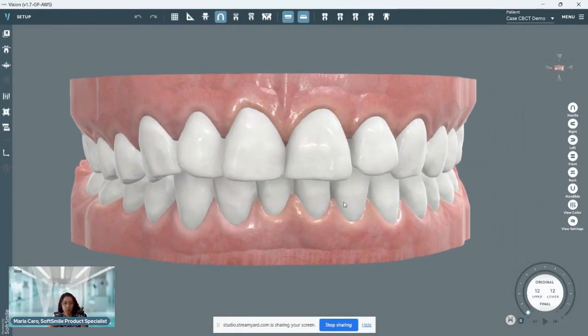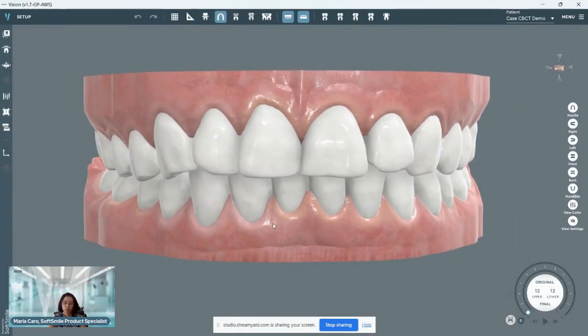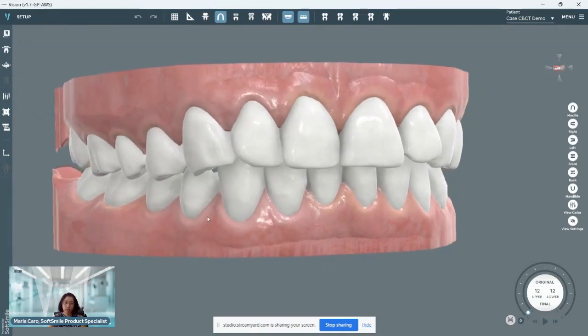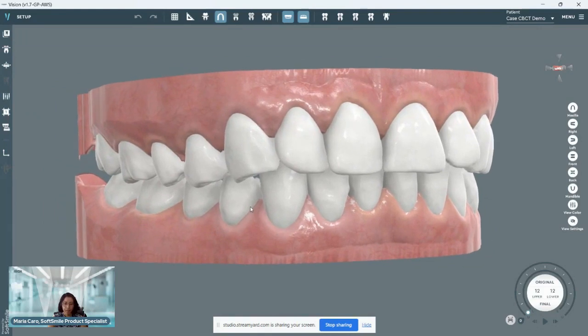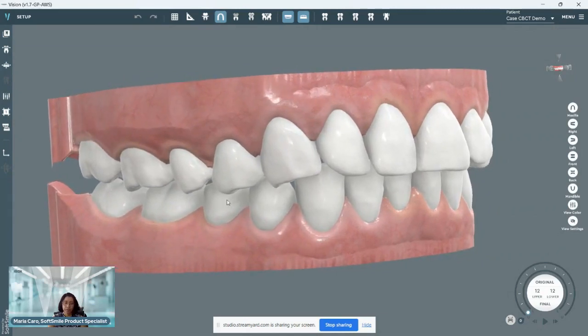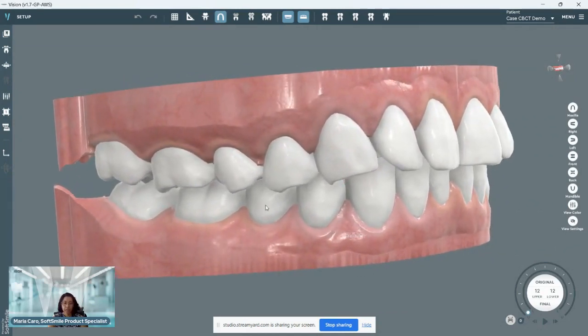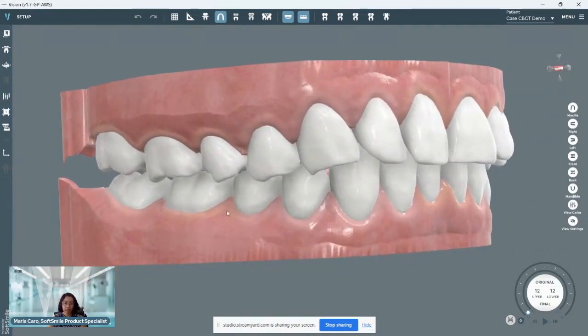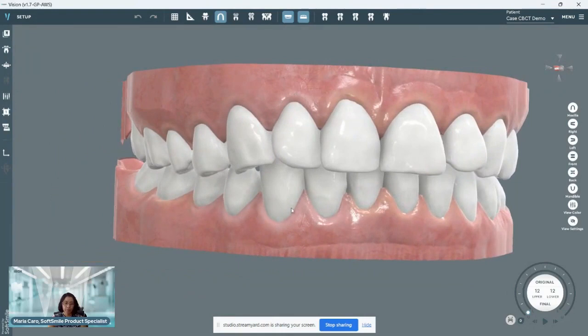His response was that in general, he uses CBCT in almost all cases where significant tooth movements are planned and where root parallelism is required due to any root anomalies, or in cases with impacted teeth. Now, the complexity of this case is that it's cosmetically demanding due to patient bruxism. He explained that the presence of CBCT allows him to ideally expose the torque and angulation of the roots.